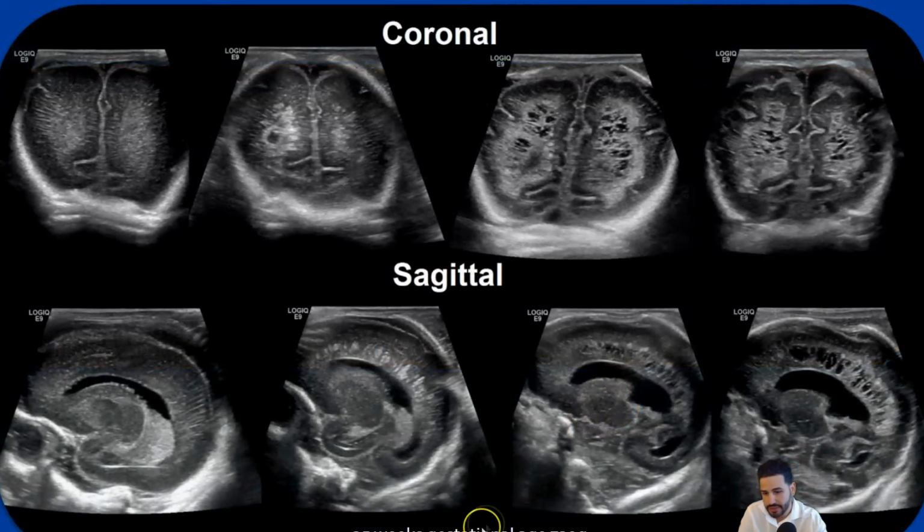Here's another one. 25-week gestational age, 720 grams, extremely premature. The initial exams were normal. Periventricular white matter looked pretty decent. And the serial exams started to show increased echogenicity in the periventricular white matter, which ended up developing into cystic spaces, which is PVL, or periventricular leukomalacia. So you see how here's normal and parasagittal. Then you start to have all these little echogenic spaces, which then become cystic spaces.